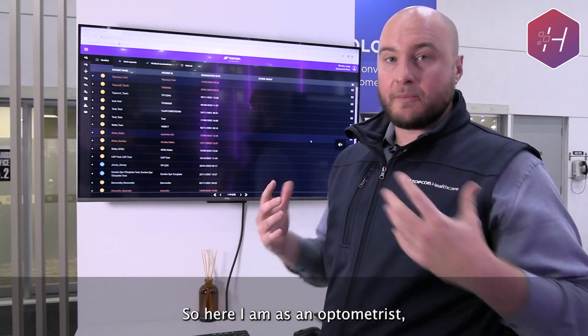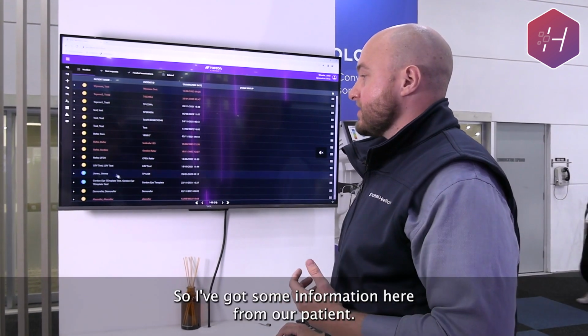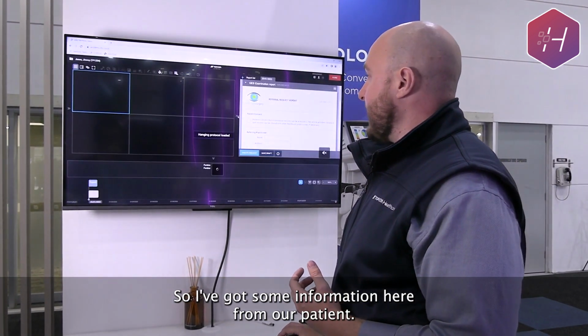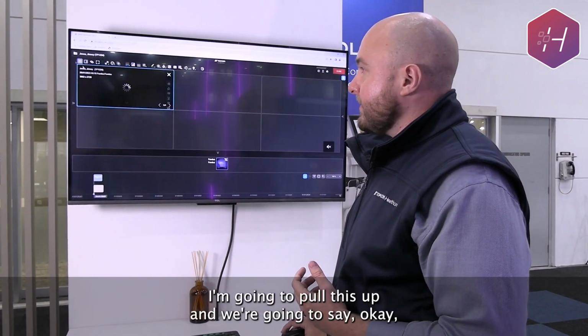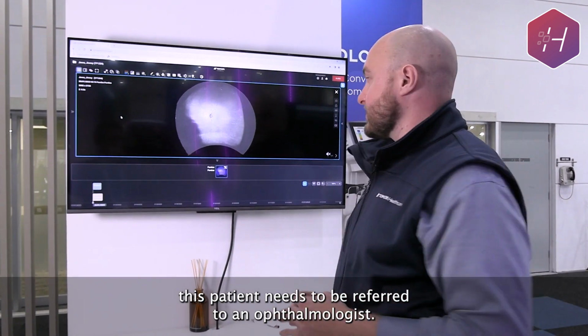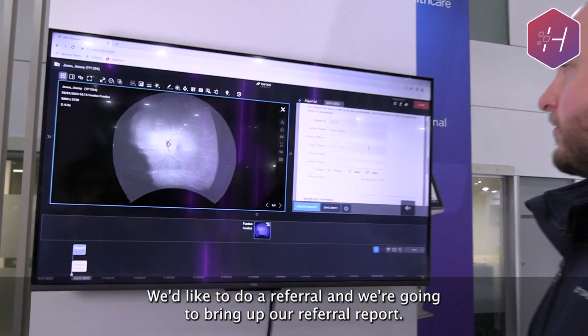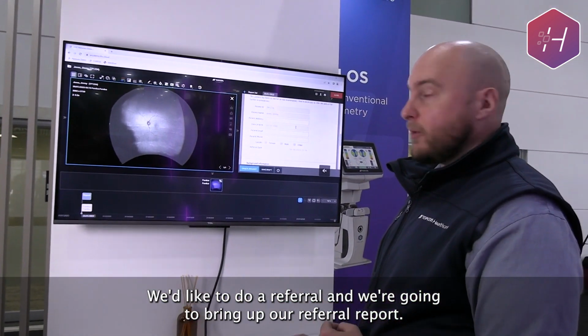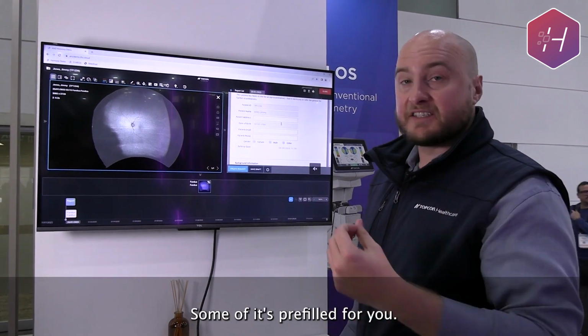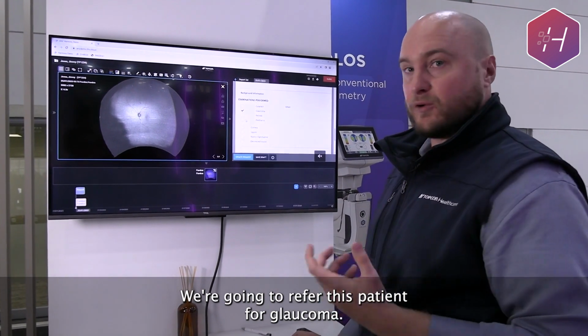So here I am as an optometrist. I'd like to now make a referral to an ophthalmologist. So I've got some information here from our patient. I'm going to pull this up and we're going to say, okay, this patient needs to be referred to an ophthalmologist. So in this case, we've got some patient information. We'd like to do a referral, and we're going to bring up our referral report. We can fill out some information. Some of it's pre-filled for you. We're going to refer this patient for glaucoma.